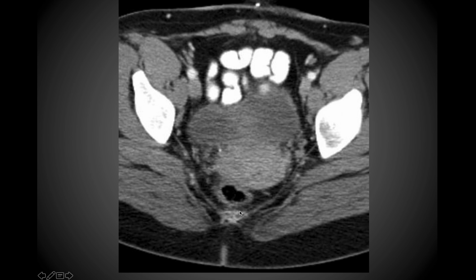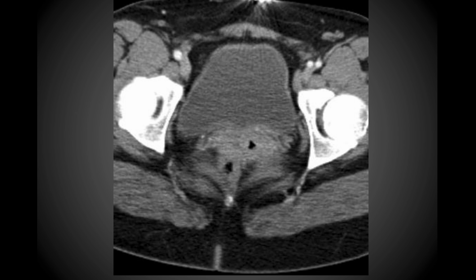Again, as we continue descending, you're seeing this is the bladder right here. You're seeing a fair amount of scattering up here. That's actually due to the presence likely of maybe a button on a pair of pants or something along those lines, but some kind of metal it looks like there that's causing that sort of diffraction of the X-ray beam as the scan was taken or obtained.